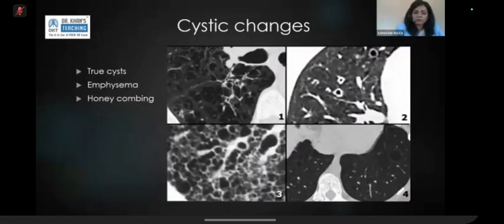When you look at number 1, and if the question is, does the patient have cystic lung disease? You have to look a bit more closely, and you have to look for the signs that can help you differentiate between emphysema and cystic lung disease. In cystic lung disease, you are saying that the cysts are within the lung parenchyma. In emphysema, what looks like a cyst or a space is actually destruction of the airspace. So emphysematous spaces do not have walls. What they do have is remnants of structures that used to be normal lung stranding through them.